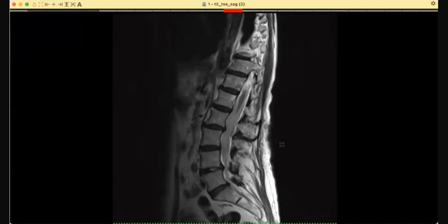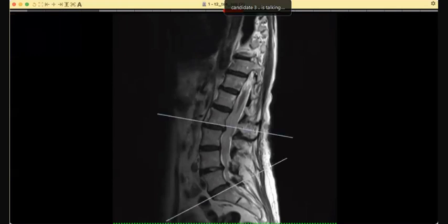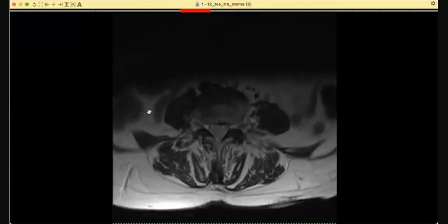Okay, I'm suspecting that these soft tissue sheets are CSF seeding or meningeal metastasis, and I want to see the other neural axis, the brain, to check if there is a primary. First of all, tell me what this is. How will you confirm what your concern is? I would like to see also the post contrast image, to see if this soft tissue sheet. Oh, I've given you a T2 weighted sequence.